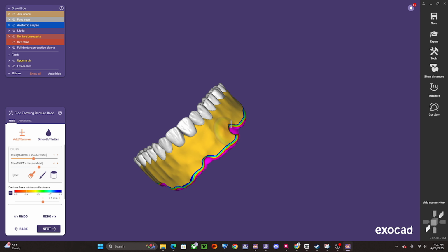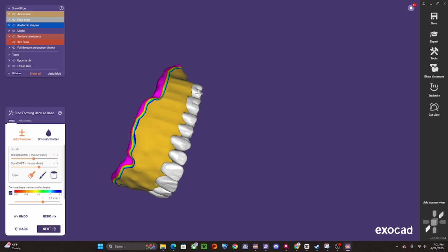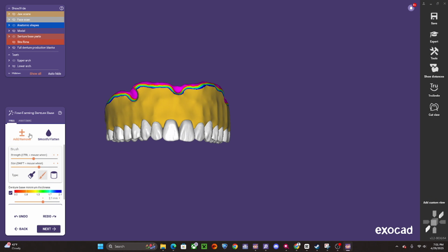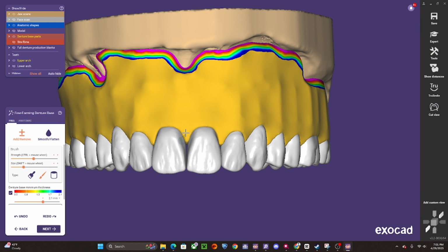But when we do the live demo and when I focus on the festooning portion, I have a video of the festooning technique. So we're just going to do the quick and dirty technique of the festooning.